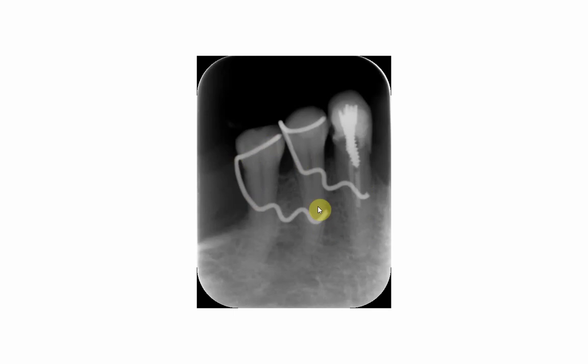You see all these areas, whether in the crown, suppose there is a carious cavity over here, it's completely blocked, even here, even here. All this image, because this is metal, is going to absorb the X-ray, and thus it will cast its shadow on the radiograph, and thus it will block whatever you want to see.